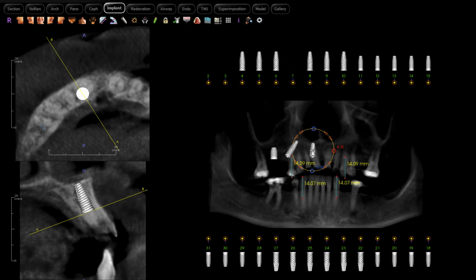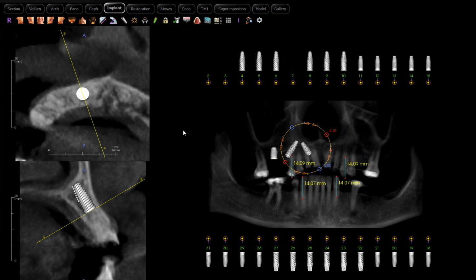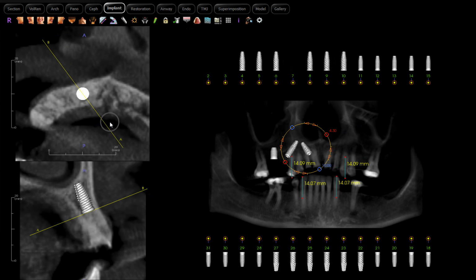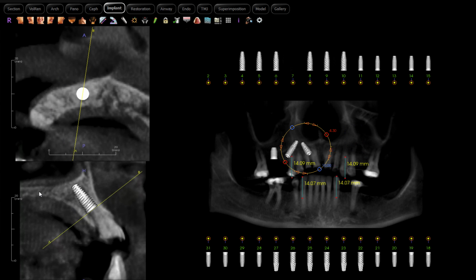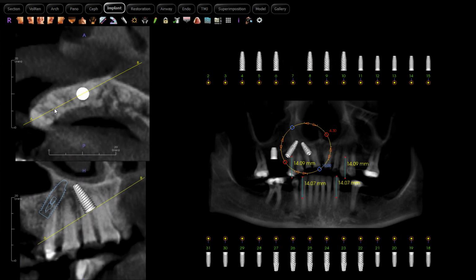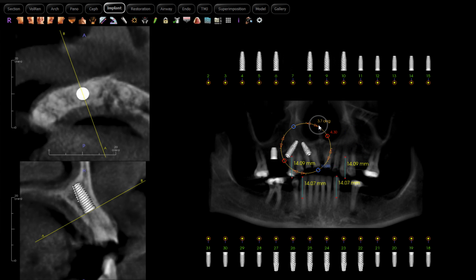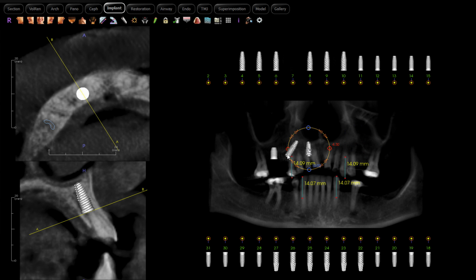And that does it. Say that wasn't enough, or we wanted to put a longer implant in there, the other thing I could do is plan it as an M technique, angle that back toward the other implant that we just placed. See the two side by side here. So we could angle that back. In this case, that doesn't afford us a ton of advantage on length because of the position of our last implant. So here I'd probably be more apt just to leave it as a 4.3x10. Two of those right next to each other in the front should be plenty. So we'll go ahead and leave that how we had it.